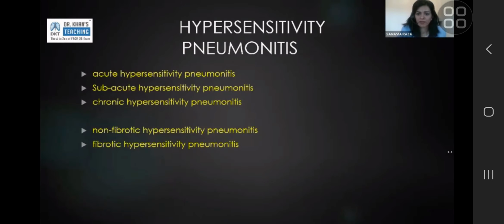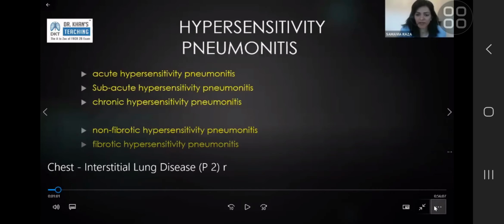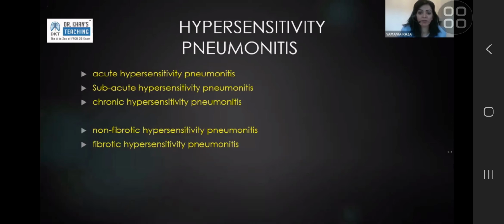Central lobular nodule and tree in bud, how to differentiate. So central lobular nodule is a dot. Tree in bud is literally a tree. So you want to see a branching opacity, like a bunch of grapes when it's really fine. But central lobular nodules are essentially just dots, very subtle, can be ground glass, very fluffy looking, or they can be very discrete and more dense looking. But they are essentially just a dot with nothing around them, nothing touching them.